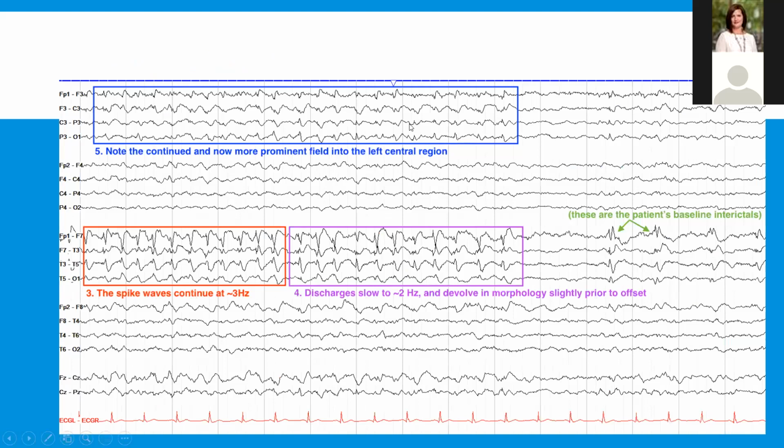And this is the next page. So initially the seizure started on the left temporal region. Now it's spread to the entire left hemisphere, right? So that's the other part of a seizure. They ramp up and they spread out. That's how every seizure works. And once it's spread to a certain point, eventually the brain's mechanism for stopping a seizure kicks in. So all these internal anti-seizure mechanisms kick in, and the seizure starts ramping down, and now the brain goes back to normal.